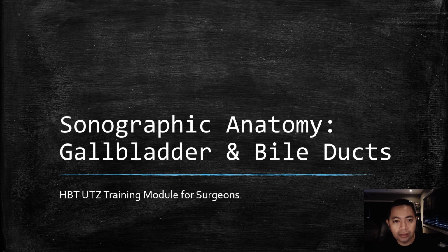This is the second section of our HBT ultrasound training module entitled Sonographic Anatomy of the Gallbladder and Bile Ducts. In this section, we are going to correlate normal biliary tract anatomy with how these structures appear on ultrasound.